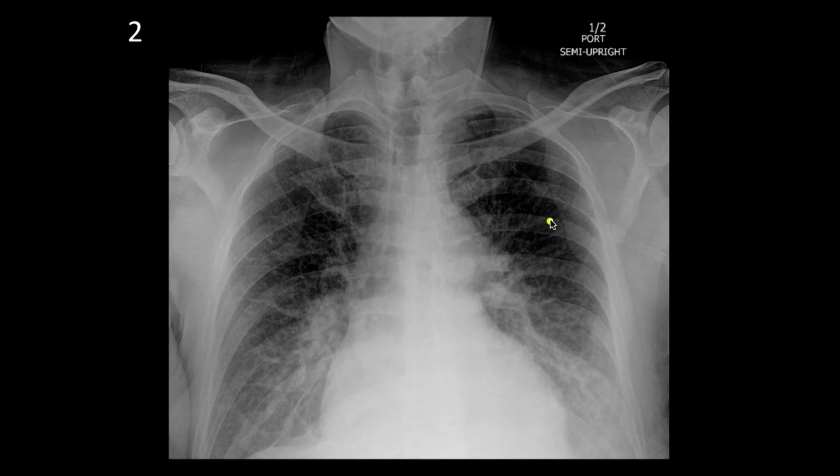If we look at the patient's next chest x-ray, you can see now that you're no longer able to appreciate the sharp margins of the lung markings. So the lung markings have become indistinct. You can see that the patient's heart now appears somewhat enlarged, and they almost certainly have developed a pleural effusion because you have this hazy opacification at the lung bases. So this patient was in interstitial pulmonary edema, and now they're developing more advanced pulmonary edema.